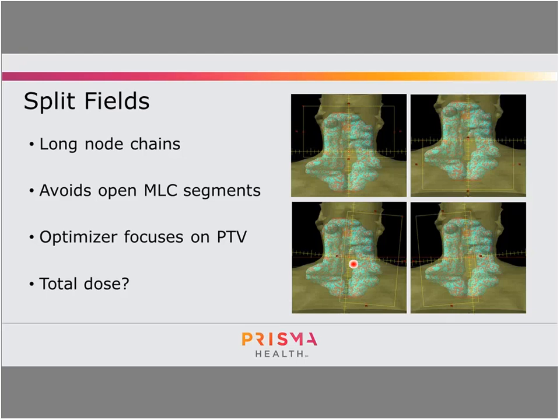If you want to actually go in and look at your integral dose, if you turn on your body contour, just the volume of the body contour times the mean dose will sort of give you your integral dose. So if that's a concern in your clinic, you could try those 2 scenarios and see if you feel comfortable with it, because it's something we use in our clinic. It works fairly well. It adds about 2 to 3 minutes of treatment time.